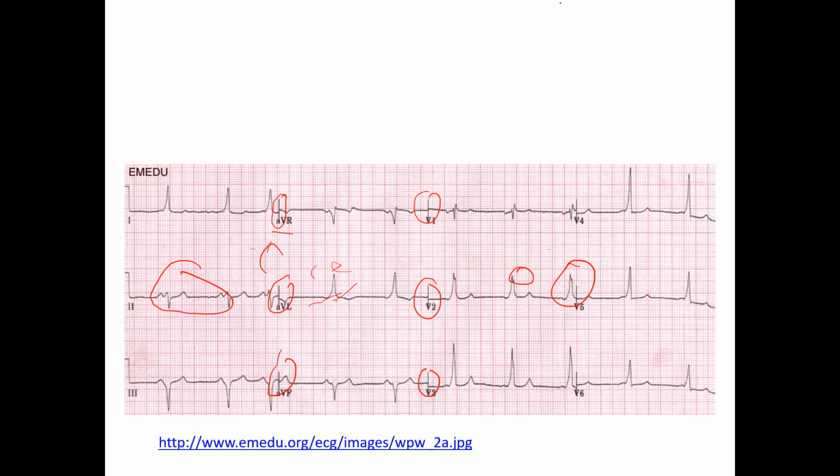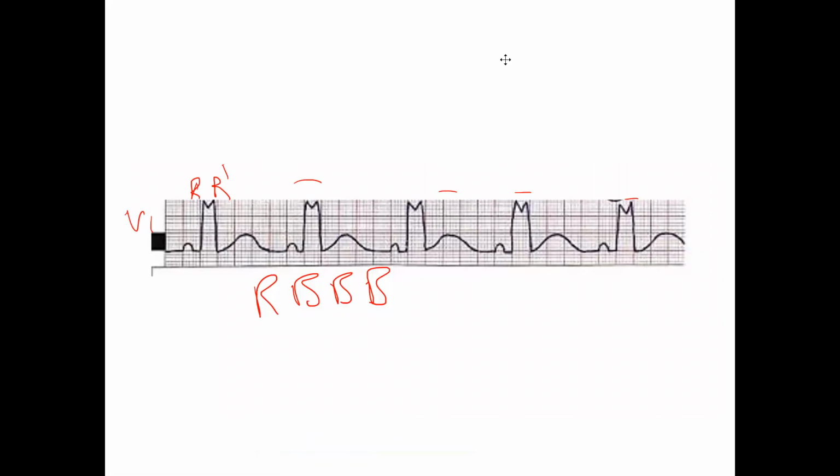Oh yeah, I had a question. So going to the bundle branch block, on an exam, to tell the difference between right and left, in this case this EKG strip that you're showing us right now doesn't say where it is, either V1 or V5. So if that's the case on an exam, you would let us know that strip is from one of those? Yeah, I would let you know. V1 or V6. Typically, I was kind of wrong on this. Typically, left bundle branch blocks look more like these. But you don't have to worry about that. That's a good question.